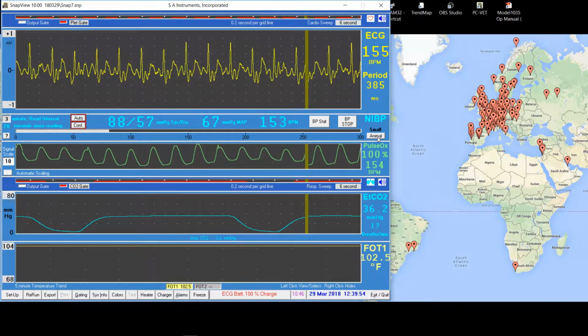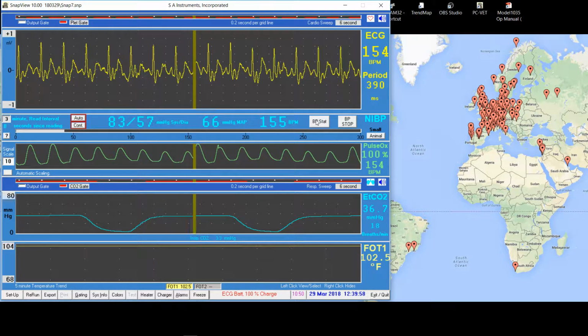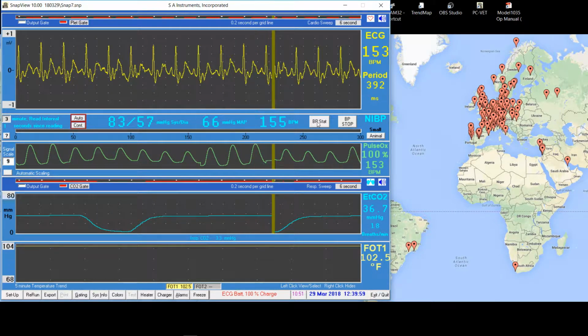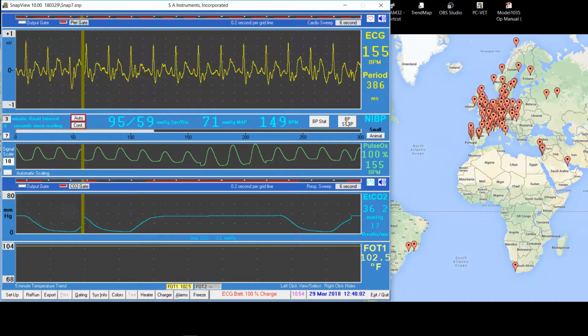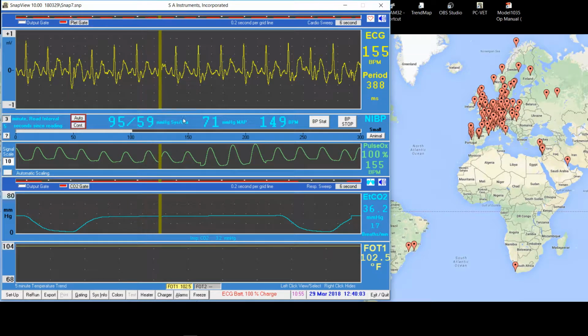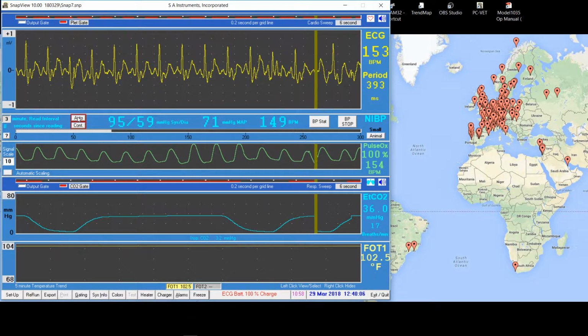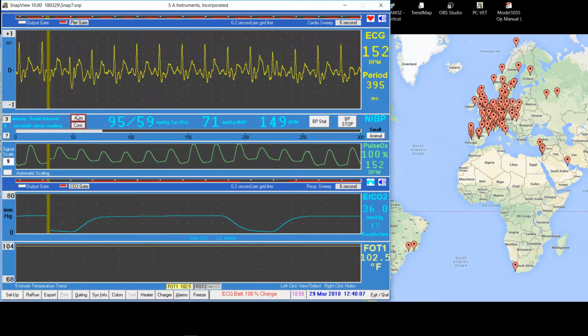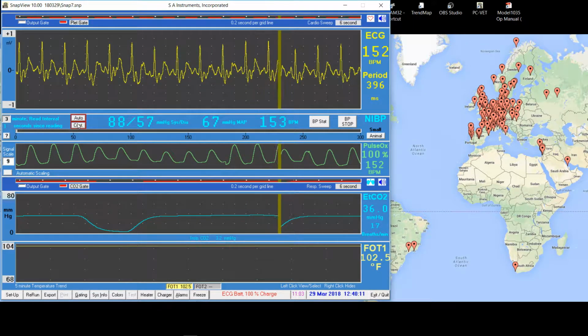On the right, the animal button selects between small and large animal modes. BP stat immediately initiates a measurement. BP stop stops a measurement. On the left, auto starts auto-cycling measurements every few or several minutes. CONT starts continuous measurements for 6 minutes or until BP stop is pressed.